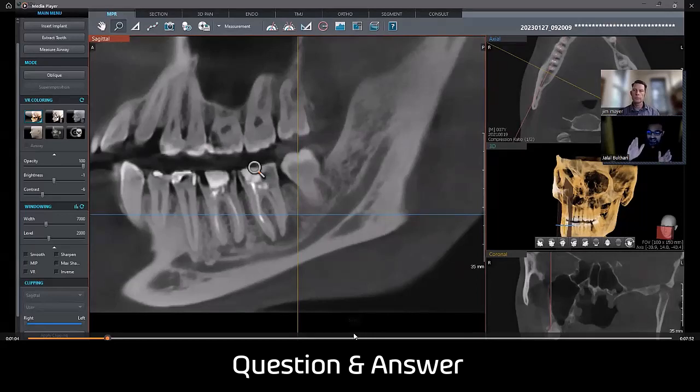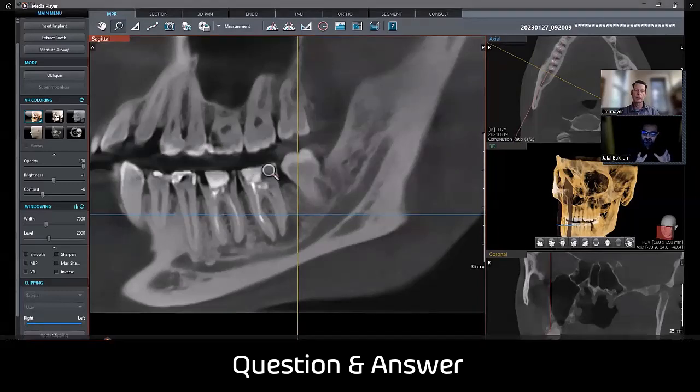Now, how that was done is by making the angulation on the axial section so that the lines are more parallel to the cross section. And what that has done is it made it more clear on the molar areas. So this is one of the very cool features that you get to use on some softwares, not all softwares, but specifically this one right now, so that you can focus more clearly on a certain area.